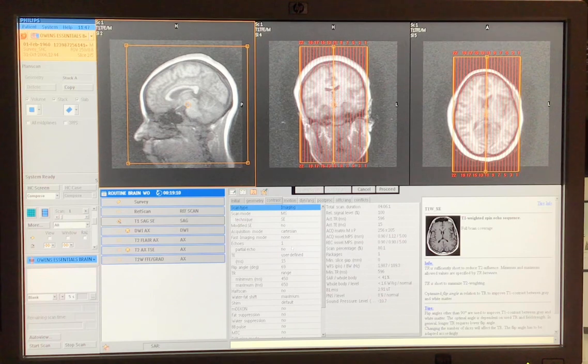And for now, what you're going to want to concentrate on is TR and TE, and then eventually I'll talk to you about our turbo spin echo or our fast spin echoes, okay? By changing TR and TE, that will change how my pictures look, black and white, right? I can either make CSF dark or I can make CSF bright.